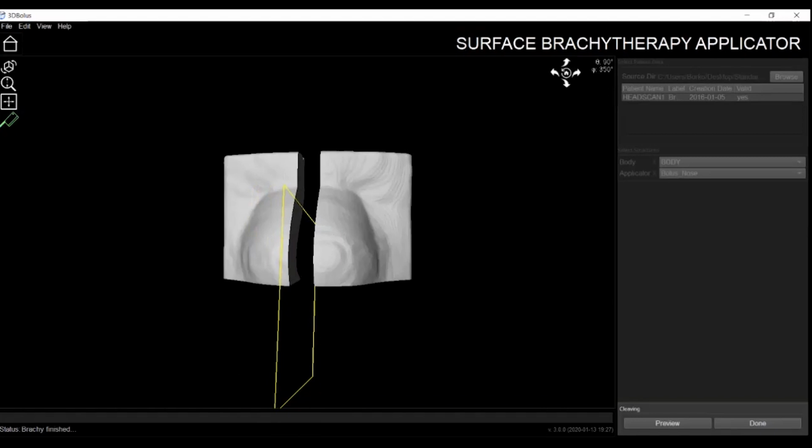The second use is if you have very challenging anatomies, like behind the ear or the nose case, with the nostrils printed, and something similar where you must cleave it in half in order to fit the applicator on a patient. So that's another use case for cleaving that we saw with our clinical partners and users. So again, a very, very useful feature.